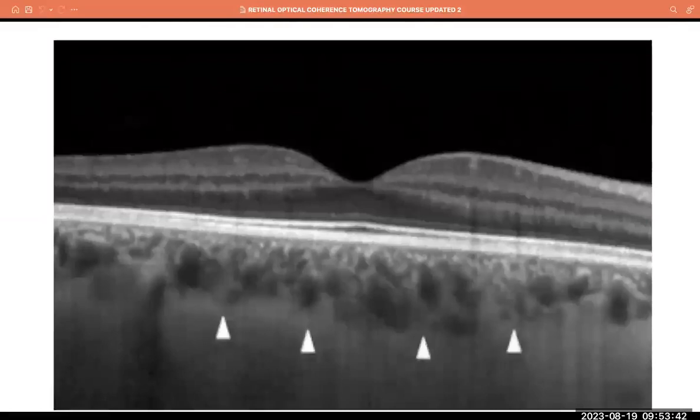Okay. Now, there are two white thick lines after the hyporeflective zone. The first of the lines is the photoreceptor interdigitations, while the thickest and the lowest is the RPE. So, Dr. Bature, can you point? The thickest and the lowest is the RPE.